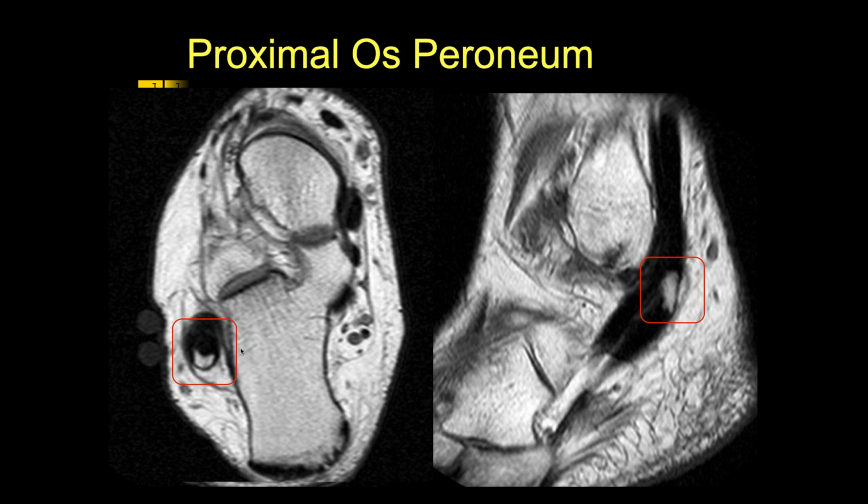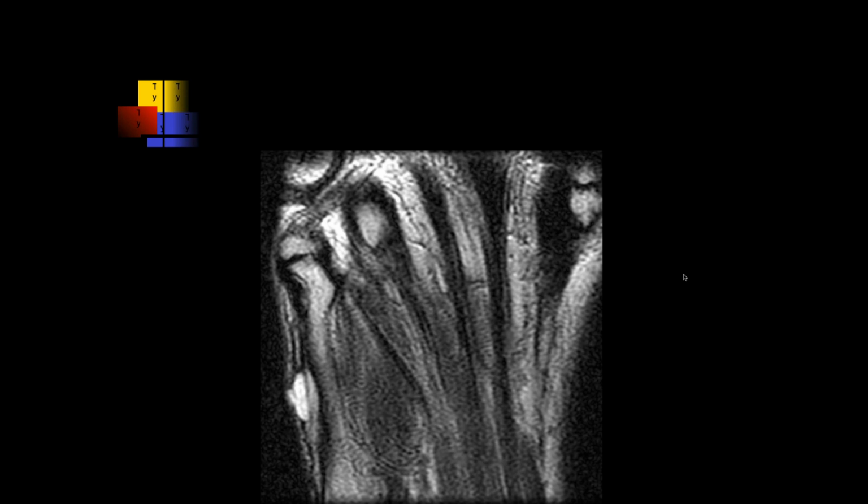In this particular case, this is probably someone who had a partial tear up here by the lateral malleolus, which is one of the 3 locations where you commonly have injuries, and it probably healed with ossification here, the sort of thing that usually happens down by the cuboid, but that process probably happened more proximally in this case. But it's a good thought to look to make sure you don't have a full thickness tear distally and proximal retraction with ossicle.